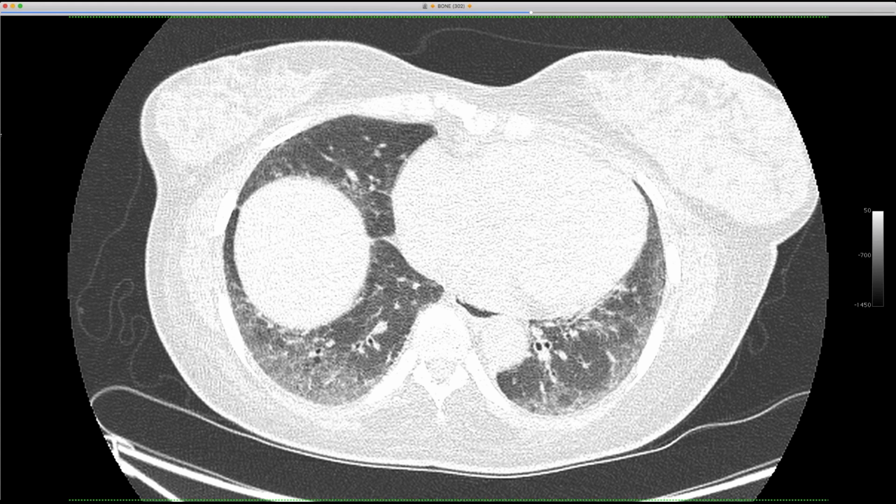Yeah. And the other thing is, it's interesting, her myasthenia had gotten better after her thymectomy, but I think there was some residual nest of thymic tissue because we can see them on CT, and that would explain some of her symptoms. But it sounds like this is a separate process, but it's hard to tell. I have very limited clinical notes because she was a new referral to neurology here from somewhere else, and I have no records of her thymic surgery. They did document from many years ago a myasthenia autoantibody.